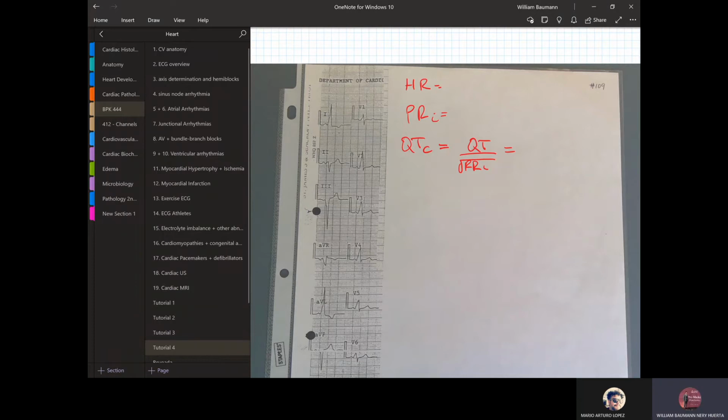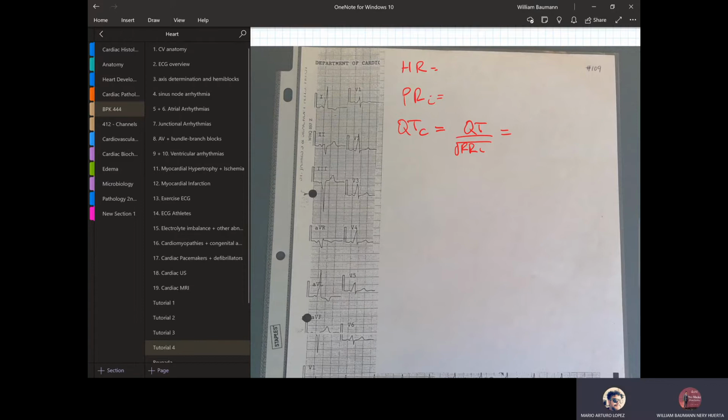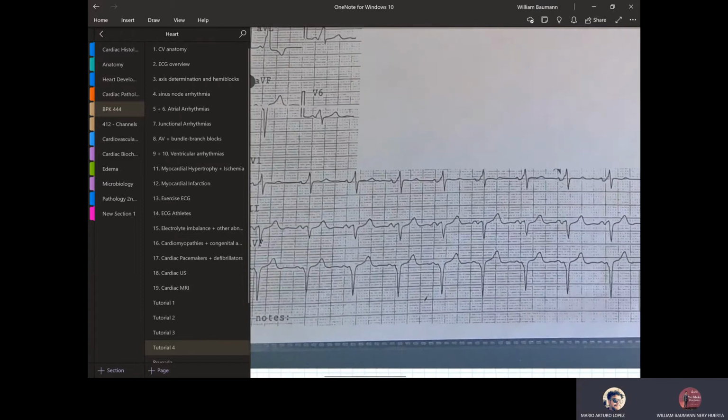Okay, so the first thing we need to work on is the heart rate. Go ahead and tell me the heart rate. We're gonna go 1, 2, 3. So that's 5 millimeters each. So that's 15 millimeters. We'll say 15.2. Well, we'll say 15. We'll say 16.